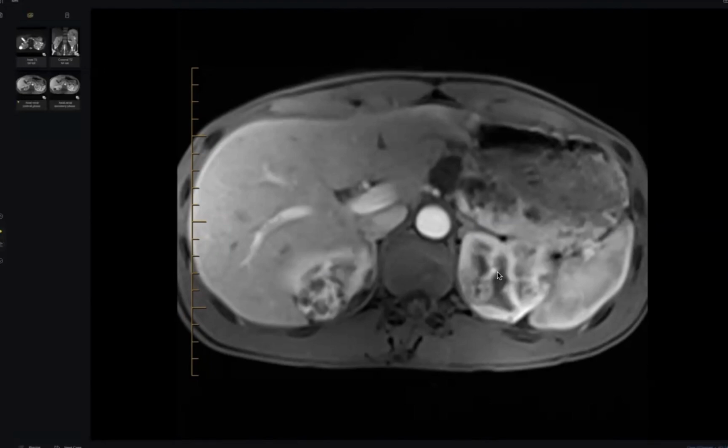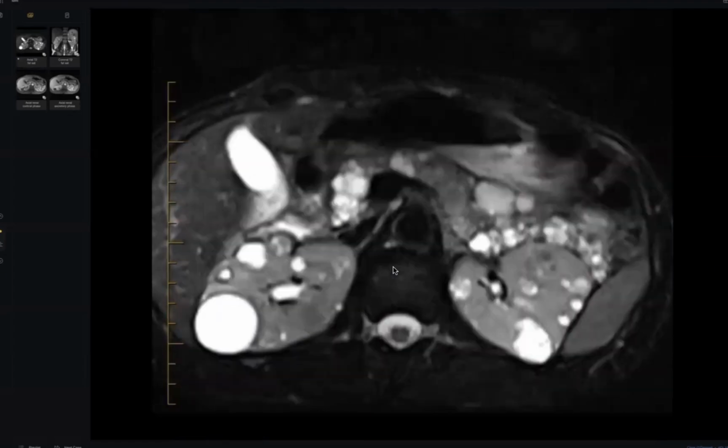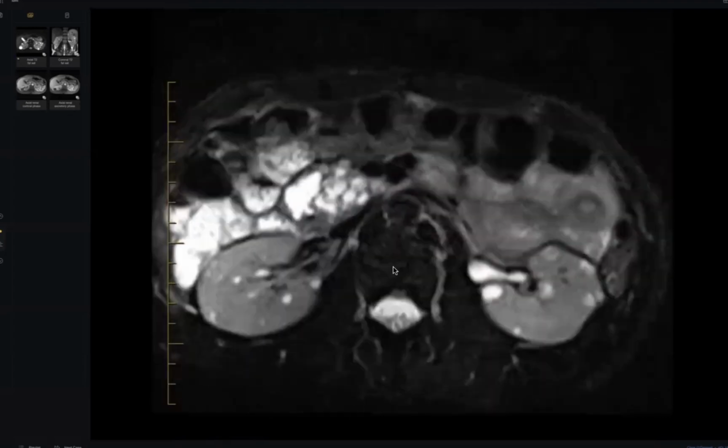So these are multiple malignancies. Multiple unilateral or bilateral, doctor? Bilateral. Multiple bilateral renal masses in correlation with renal cysts, pancreatic cysts, and multiple pancreatic lesions as well. What's your concern?